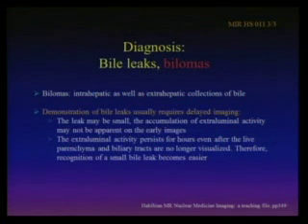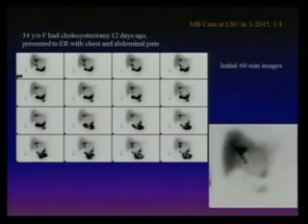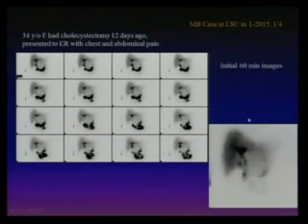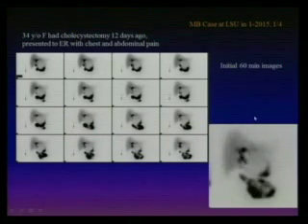We had a case just a couple weeks ago. It was a very small leak. So this is a similar case, I'll just go over that. This is our case. We had a SPECT CT. We did the initial imaging. Of course, the patient had a cholecystectomy.